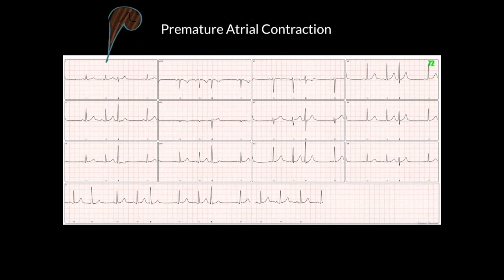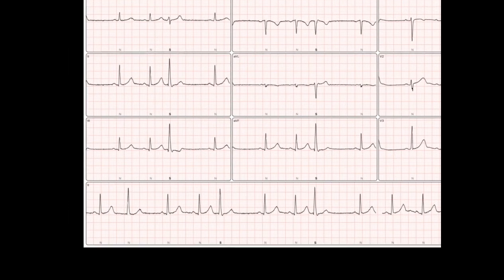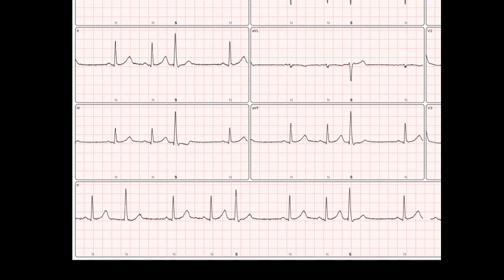As usual, we begin by analyzing the P waves. So we look at the inferior leads, and we do identify P waves, but unfortunately, even with the upright P waves, we find that the RR intervals are irregular, so we need to consider the problem.